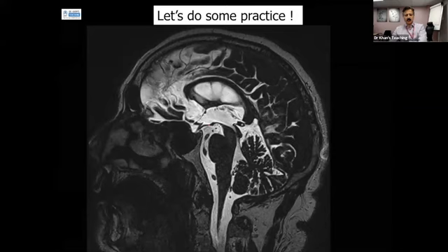And I will open the chat, the chat is open, but can somebody tell me what is this, where I am pointing out this structure? On the chat, please. Pineal, very good. So what will be this?